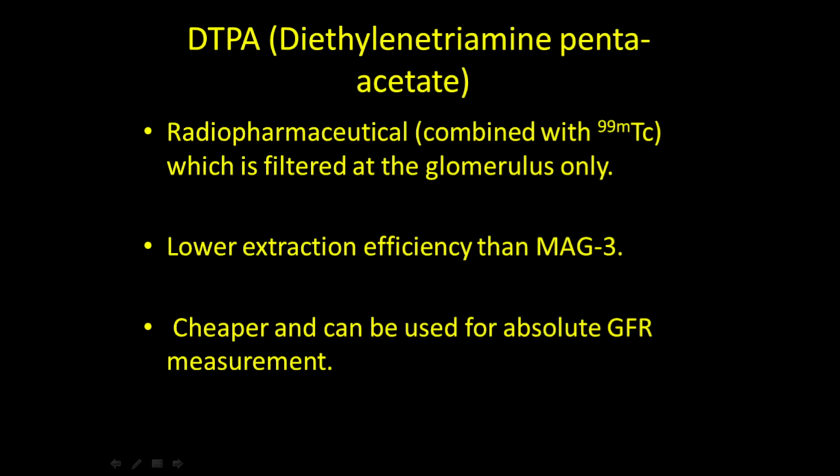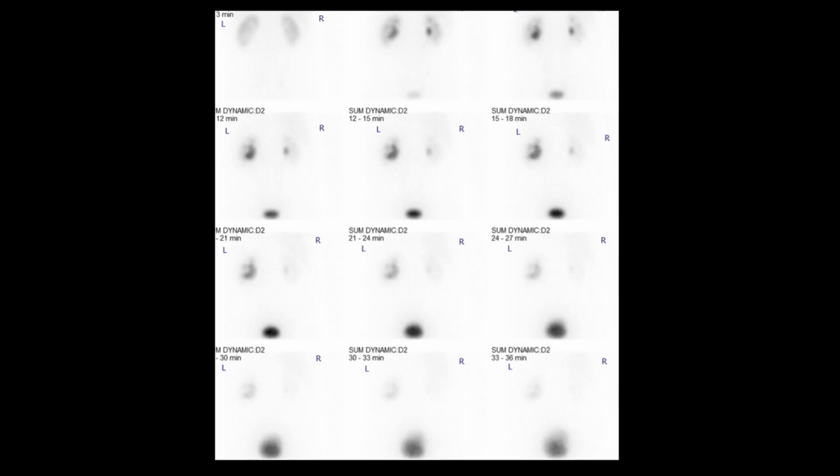So really the pictures that we're going to see with DTPA won't be significantly different from MAG3, except possibly the image quality might not be quite as good. So what we're going to do now is look at some of the pathological conditions which we might see on MAG3 and DTPA scintigraphy. MAG3 and DTPA essentially will produce the same imaging appearances.